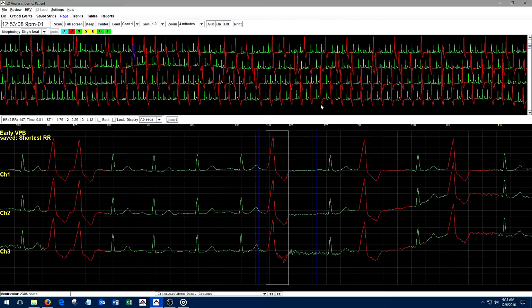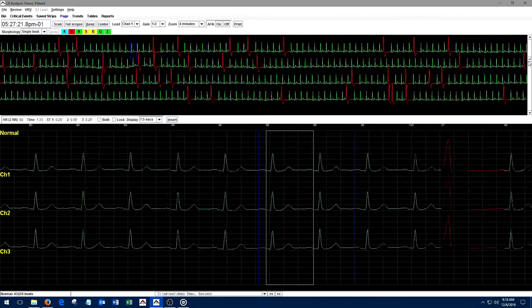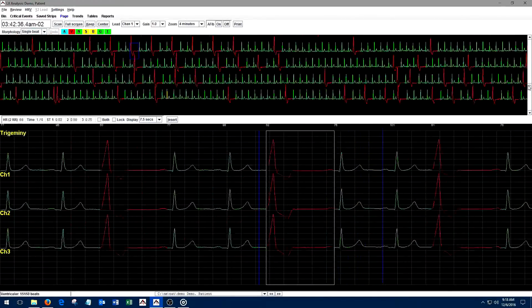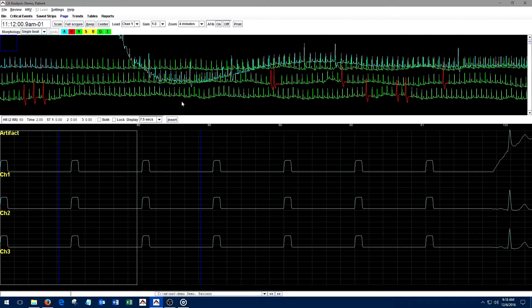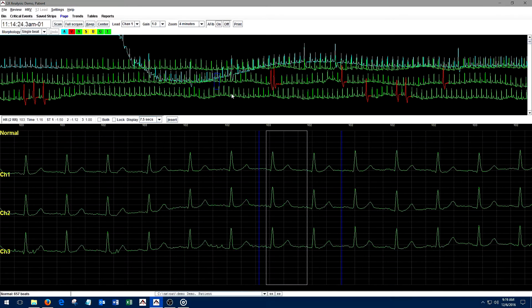The window is divided into two displays, a miniature single-channel presentation and an expanded 3-channel display with a background grid. You can toggle the window format back and forth between 1, only the miniature ECG, and 2, a combination screen with a single-channel display on the top half and an expanded strip on the bottom, using the full screen Expand button.